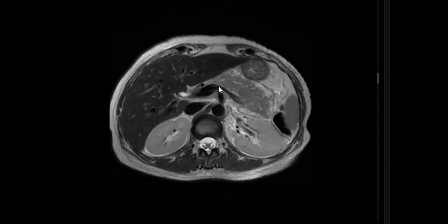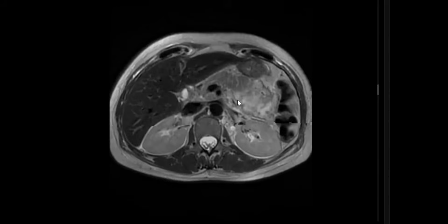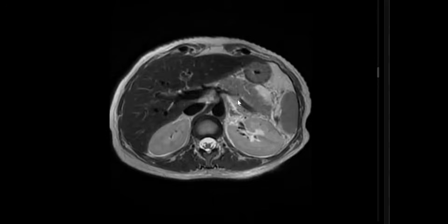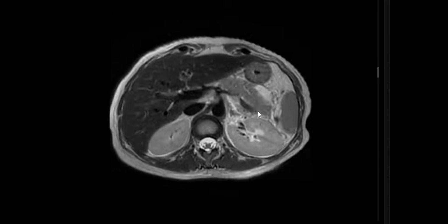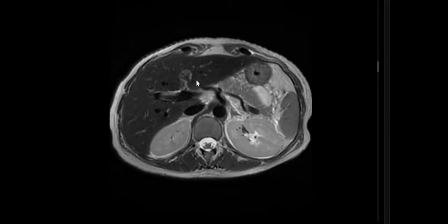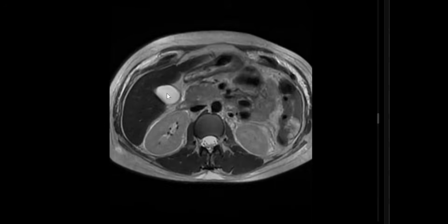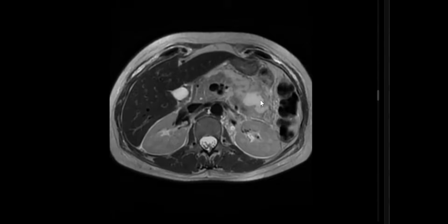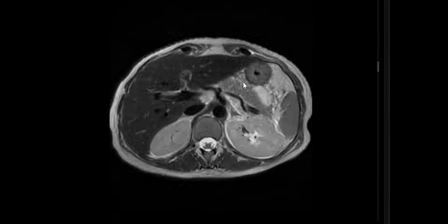I cannot appreciate any filling defects within the pancreatic duct or in the gallbladder to suggest the presence of stones. This can be acute pancreatitis. Also a pertinent negative: patent, preserved signal void vessels. This is important; I want to rule out any thrombosis. No pseudoaneurysm, no rounded structure with signal void or swirling. Very good point from you. No gallstones. What is the expected cause? Maybe related to pregnancy, maybe alcoholic. Okay, so in this pregnant lady, it's a case of acute pancreatitis.